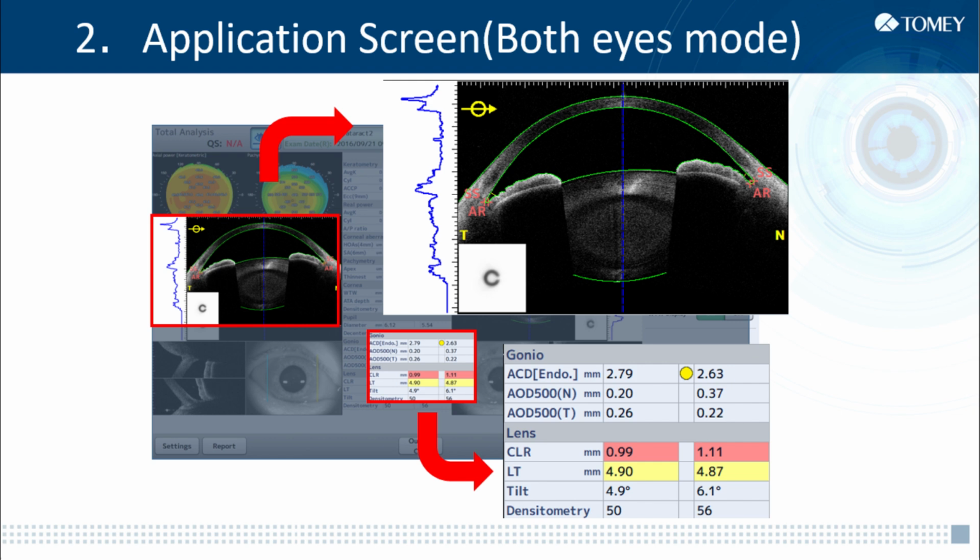For example, if the patient has Fuchs dystrophy, which affects corneal endothelial cells, densitometry around the back surface of the cornea would be higher. And this Landolt image is calculated from higher order aberrations. That means this distortion in appearance cannot be corrected by glasses or IOLs. This image would help the patient to understand the severity of the corneal aberration intuitively.